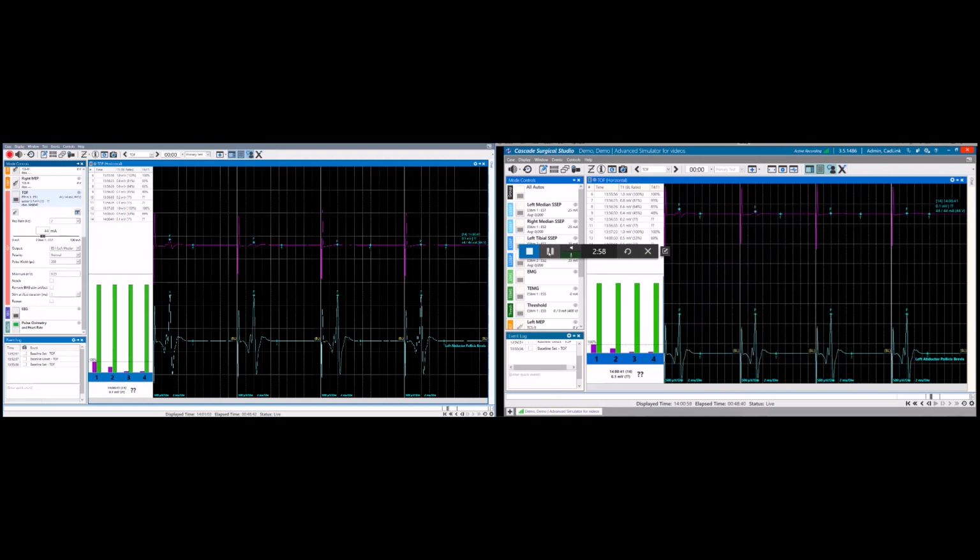During this time, the chat and event log entry are fully supported, just like in an actual case. This means that the reviewer and the monitorist can enter events and have two-way chat.